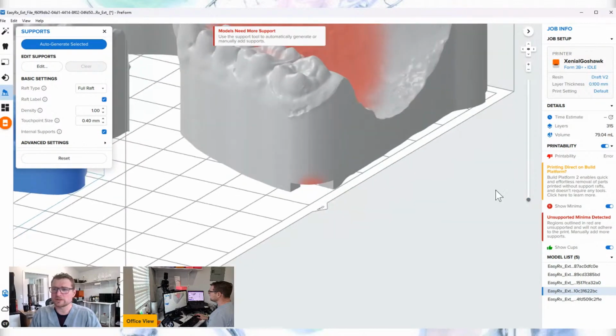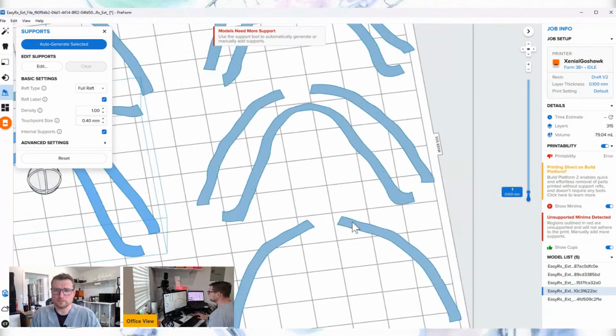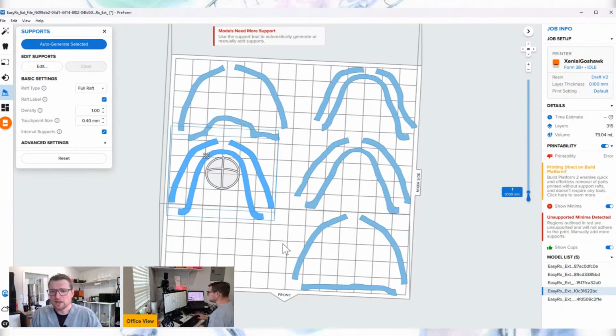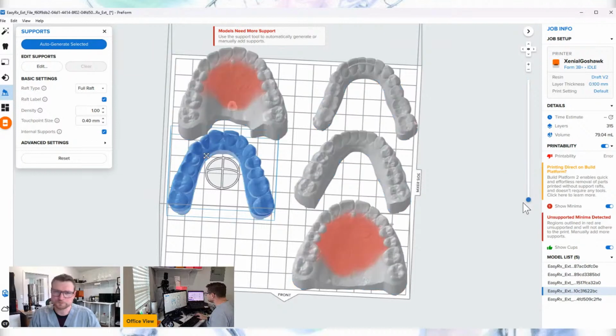And this is another reason I do the, let me go page up, I do drain holes. One is I can get it to drain easier when I put it on a tilt. I'll show that in a second. But also it doesn't create a suction cup. If I didn't have that, let's see if I can show this. If it just printed like this, that would be kind of a suction cup and it would tear off the build plate, and it's not good. So I'll put drain holes on there to allow some movement of stuff.